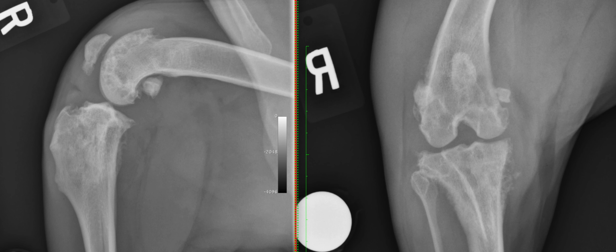Today's example is a 6-year-old male-neutered large crossbreed dog with a chronic right hind lameness. Once you have reviewed the radiographs using your systematic approach, then you're ready to watch this video. Now, I will highlight the most important findings for the stifle in this case.